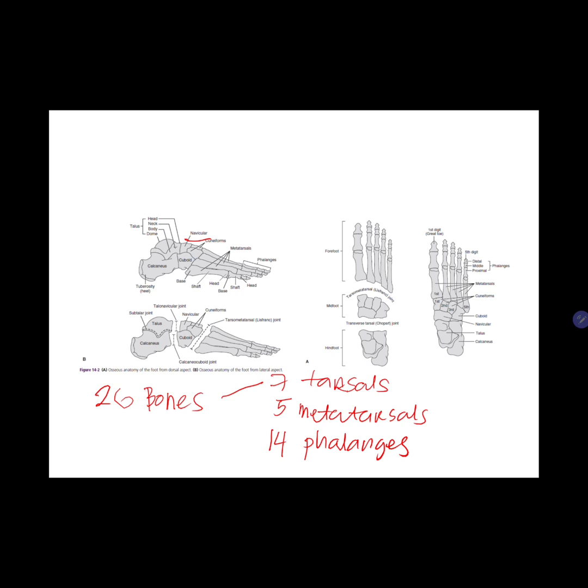As for the phalanges, the toes or digits are numbered from 1 to 5 beginning on the medial or the great toe side of the foot. And the great toe is distinctive in that it is composed of only a proximal and a distal phalanx. The remaining toes each additionally possess a middle phalanx. The distal phalanges of the second through fifth digits are usually quite small and sometimes difficult to identify on radiographs. Middle and distal phalanges are not uncommonly fused.